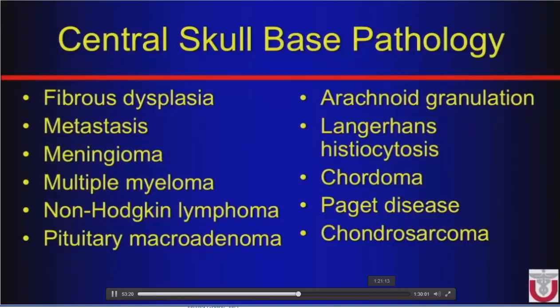So we have all these pathologies, and we want to be very careful about the words we use: expansile, destructive, permeative, sclerotic, because as soon as we say one of those words, it may lead us down a different path. But we want to look carefully at both the CT and the MR findings. As you heard in the earlier talk, those two studies are complementary. We use them both, and we want to pay attention to how both those imaging pathologies affect the normal anatomy.